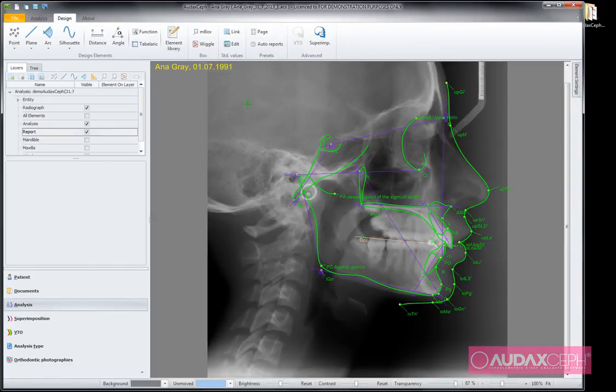So what is behind? I would like to show you that awesome technology that we have here. I'm going to create a point here, and another point here, and another point here, and then I'm going to create a plane between these 2 points, and then I'm going to create a parallel plane to this one going through this point. Now you can see that if I select this plane, I cannot move it. I cannot do any movement.